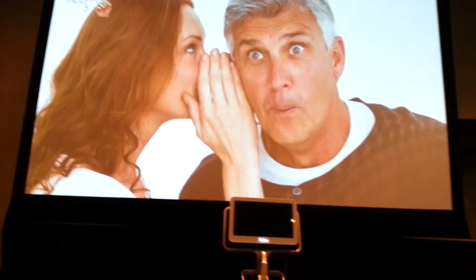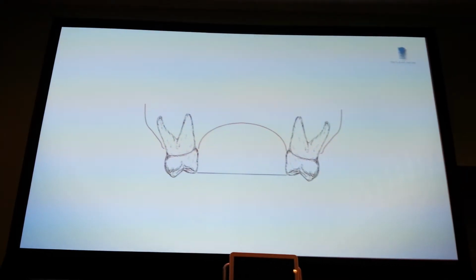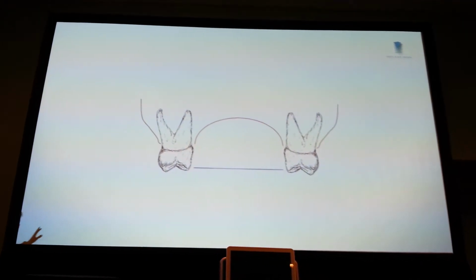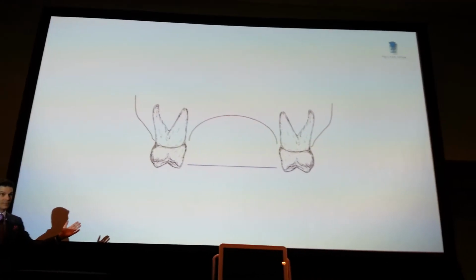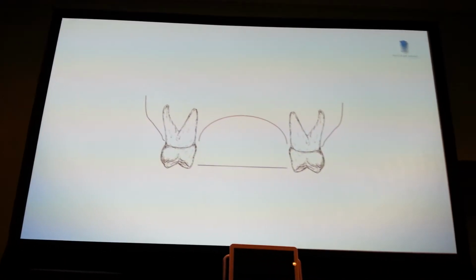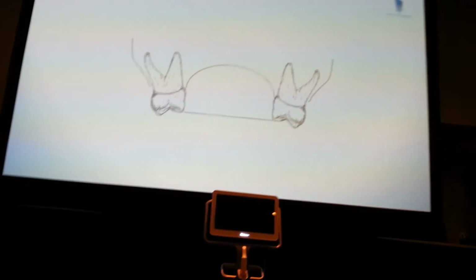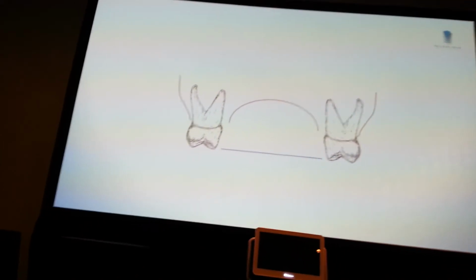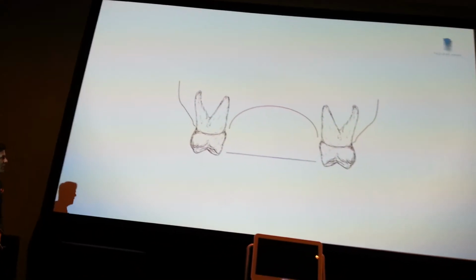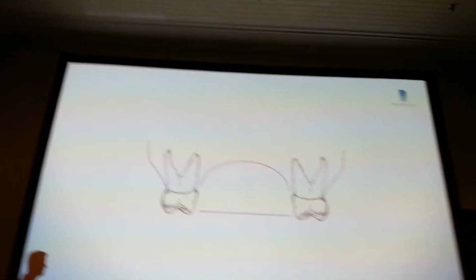When you have a tooth on an implant, a central, and you still want to move them, this is perfect. This is what we're looking for. Because then if you're pushing, this will happen. So you look at the initial position of your teeth. This is what we want to see. If you see arches like that on top and bottom, it's like a gift. If you have this and you want to do this, because this would be the real expansion we want to do, if we want to create space.